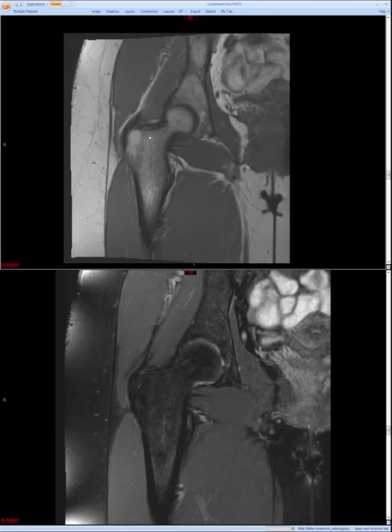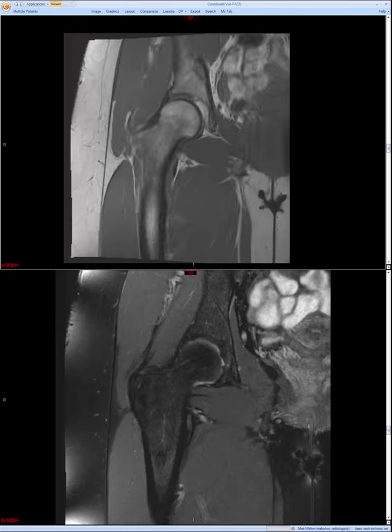And then we should ask ourselves, is it in a plausible location for red marrow? Yes, it is, because in the long bone, the proximal metaphysis is the very last spot for red marrow to convert to yellow marrow, and also it's the first spot to reconvert to red marrow in times of stress, when the body has to rev up those red blood cell producing factories once more. So seeing red marrow in the proximal femoral metaphysis is not unusual at all.